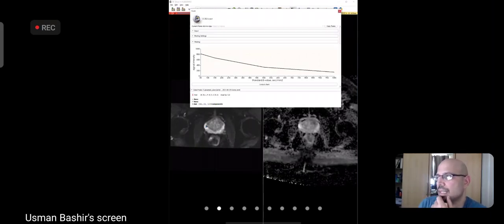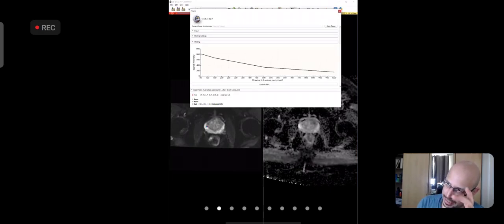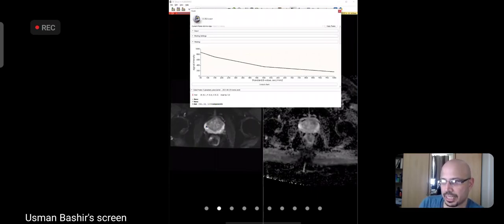तो ये जो slope है ना, आप देखेंगे left पे बहुत high signal है. फिर जैसे जैसे B value बढ़ी और 1000 की तरफ गई, signal drop हो गया. तो आप देखेंगे ये जो slope है ना, it is actually a steep slope. That is a high ADC map value, that is the ADC, the apparent diffusion coefficient. जितना steep slope होगा उतना bright ADC map होगा, वो benign lesion होगा. So this is benign. मैंने क्योंकि देखें आप माउस को place किया हुआ है peripheral zone.